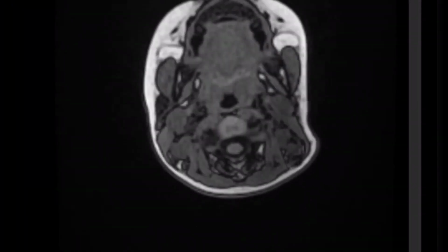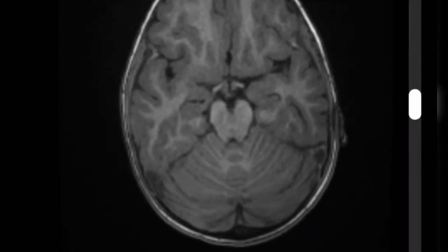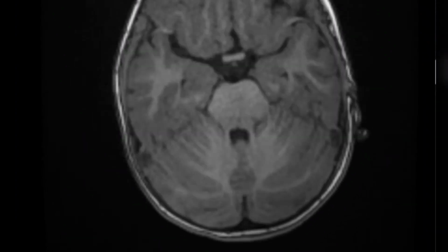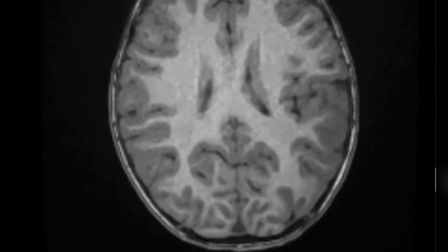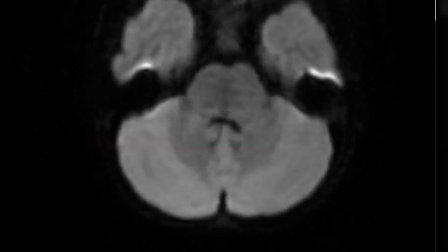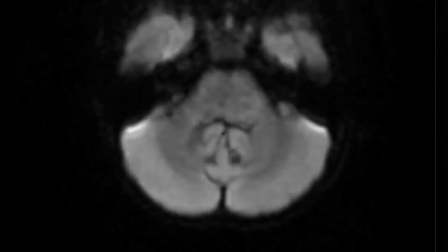Adjacent pontine and middle cerebellar peduncle non-enhancing patches of abnormal signal are likely representing edema or gliosis. A DVA is characterized by the caput medusae sign of veins draining into a single larger collecting vein, which in turn drains into either a dural sinus or into a deep ependymal vein. The appearance has also been likened to a palm tree.